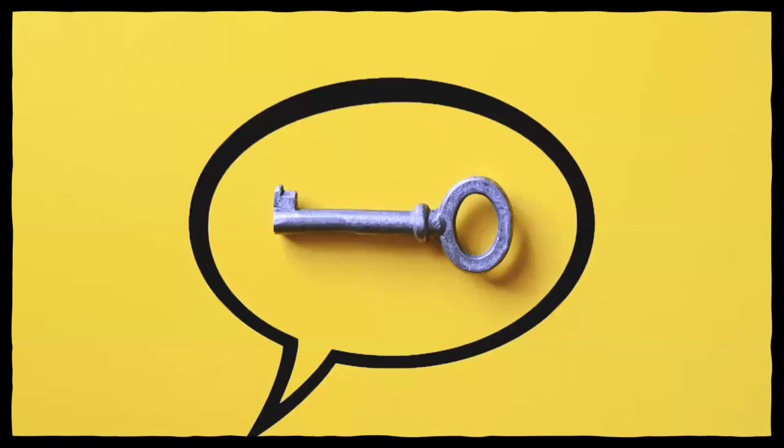So that concludes my introduction to advanced MRI techniques. It's a pretty short presentation, but it's just something to get you going. I think getting familiar with the basics in radiology is the best way to learn radiology and then build upon that. So in the future I might go into a little bit more detail.